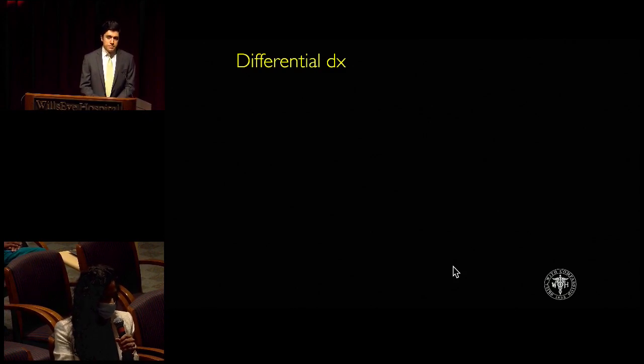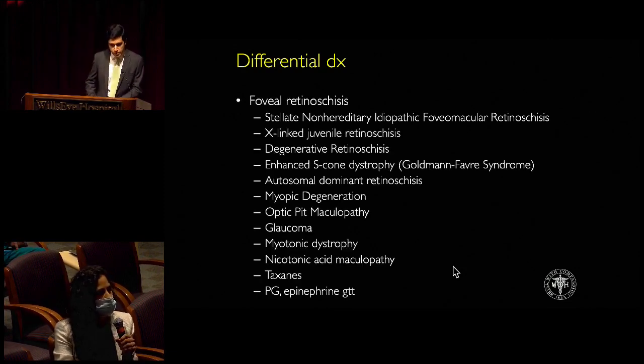This is more schisis and not so much macular edema, but non-leaking macular edema. You can think of different medications that can cause that. Niacin and taxanes can cause that as well. Excellent. So you touched on all the important ones that we had in mind.